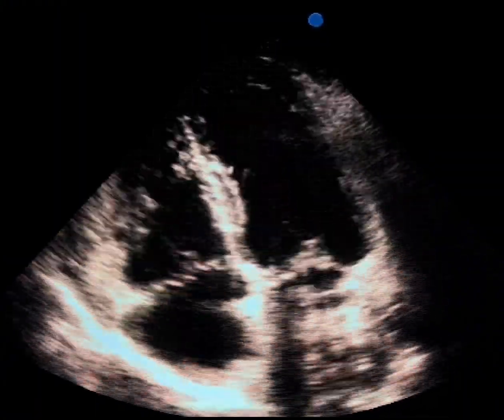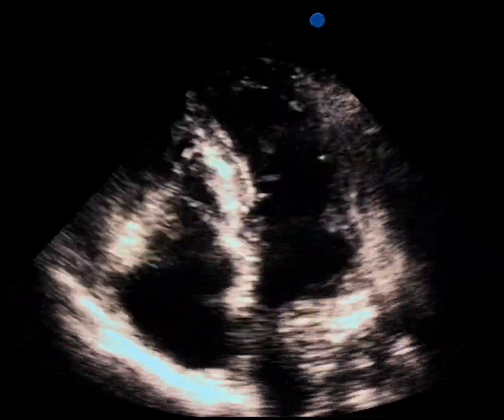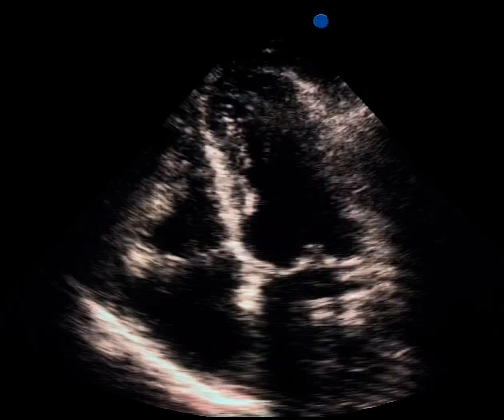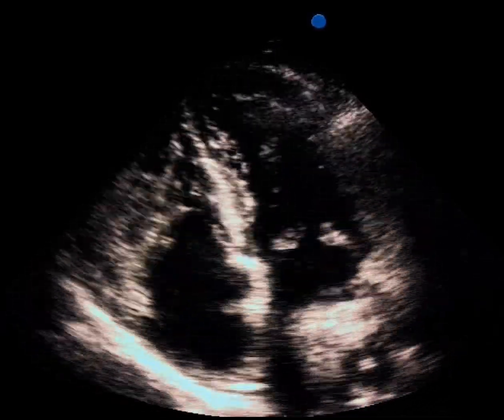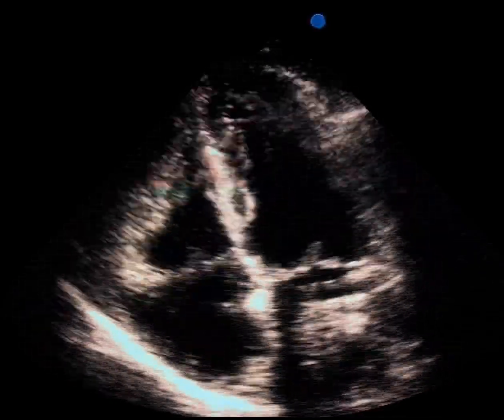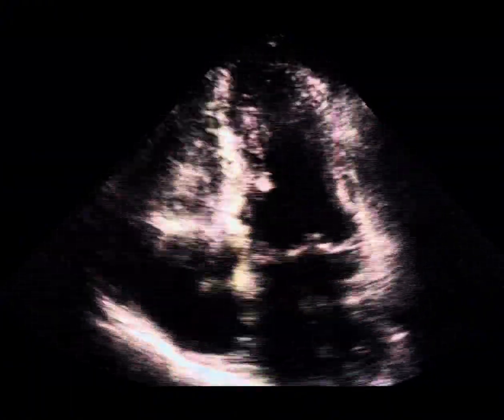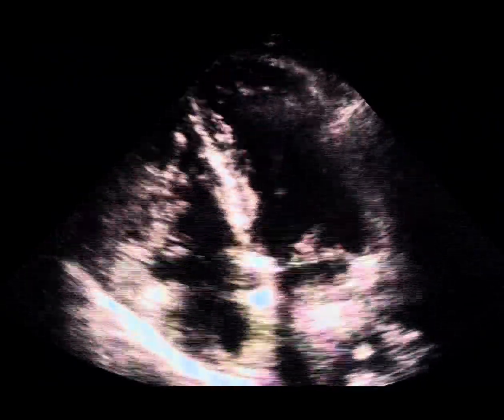It is an excellent example of one of the most important ultrasound pitfalls. A slice thickness artifact or elevation beam width artifact is responsible for extracardiac structures appearing to be inside the heart. A two-dimensional echocardiography is not a zero-thickness plane. It has a finite thickness.